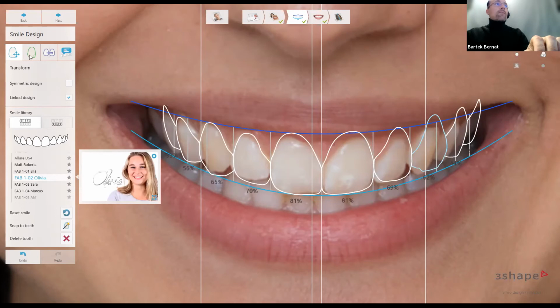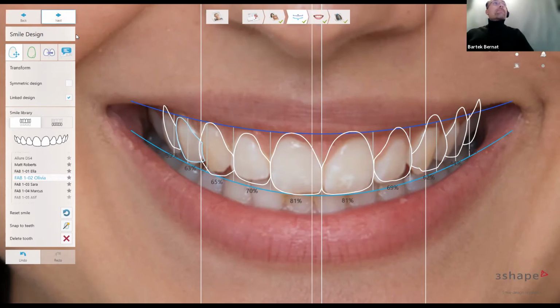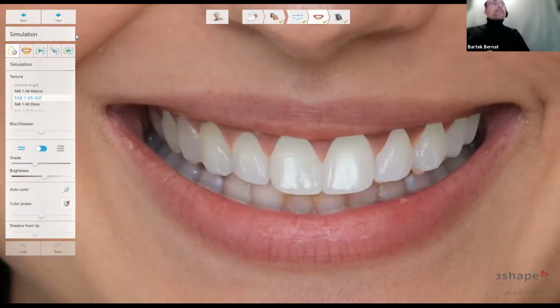And yep, you can also do some freeforming if you want. This is very rough, obviously, so just correct this a bit. You can copy, mirror some of the stuff. You can also do some measurements to be more realistic, measure something on the patient's teeth and then apply it over here. Once you do next, we're just going to see the actual teeth as they should look.